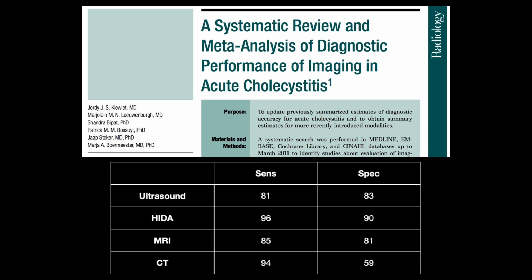And so here, I think the takeaway is, when you're concerned, right, and you see it on ultrasound, you probably got it, right? Saying ultrasound's a justifiable first test that you should use to evaluate for cholecystitis, right? Now, HIDA scans may outperform, but I don't get those routinely in the ED. And certainly MRIs are not immediately available. Even though I have an MRI machine, getting one in the ED is going to be this huge, prolonged, protracted affair. And so for similar test characteristics, the ultrasound performs a lot more quickly than the MRI machine.